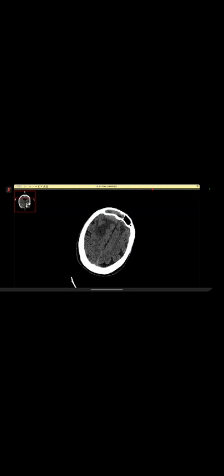Look at the sinus. There is a bit of high density, which might be because of chronic changes. And as we go, the candidate did very well that picked up this lesion here. And you can see in the nasal cavity how it is causing expansion of the medial wall. So something is sitting there.